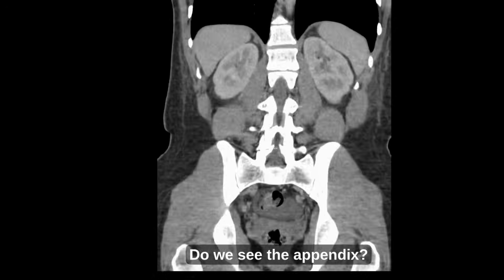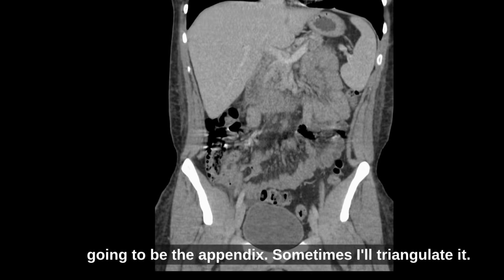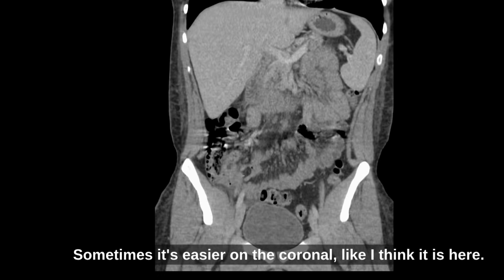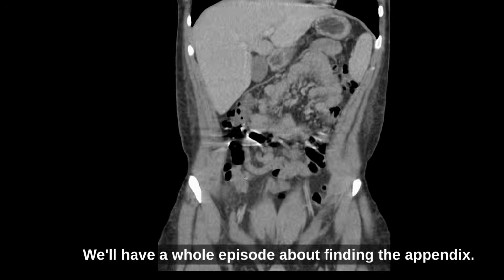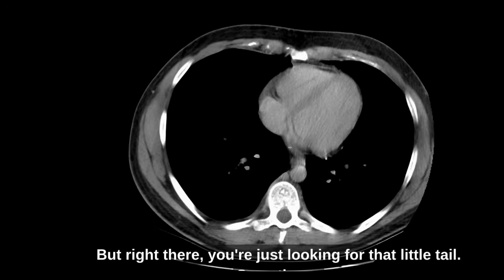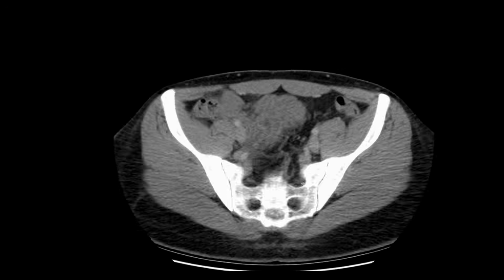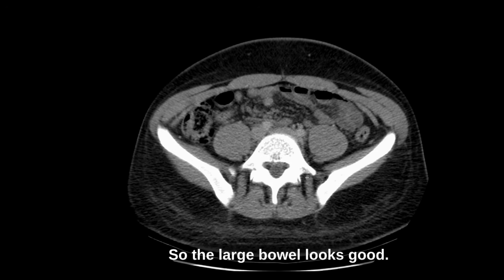Do we see the appendix? I think that little tubular thing right there is going to be the appendix. Sometimes I'll triangulate it. Sometimes it's easier on the coronal, like I think it is here. That little tubular thing coming off is going to be the appendix. We'll have a whole episode about finding the appendix, but right there, you're just looking for that little tail sometimes. But if you triangulate it, it's a lot easier. So this large bowel looks good, moderate amount of stool.